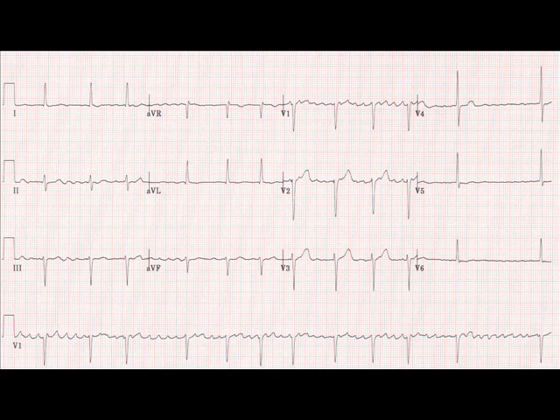As you now know, what I'm looking for is one clear rounded P wave per QRS complex and T wave. I'm not getting that. This patient is not in sinus rhythm. If you look between the QRS complexes, what you see is this constant undulating, fibrillating, wobbling baseline. When the heart rate is normal, you should see a flat line somewhere, the isoelectric line, certainly at the end of the T wave and before the next P wave. You certainly don't see that here.